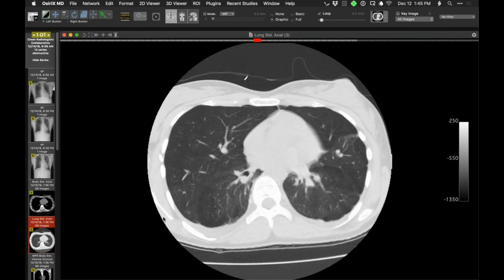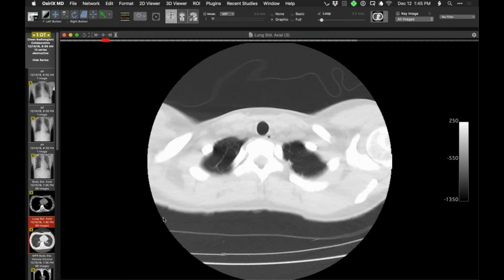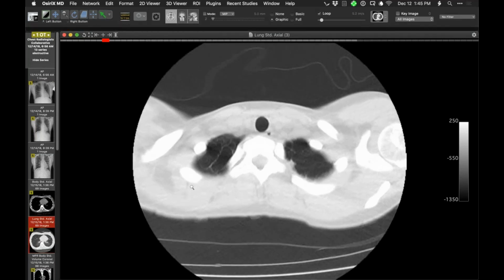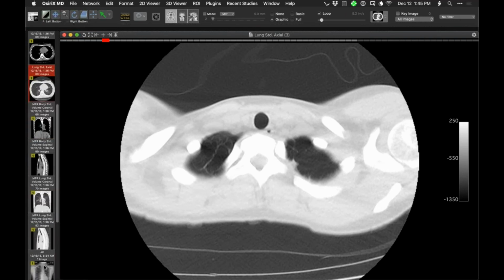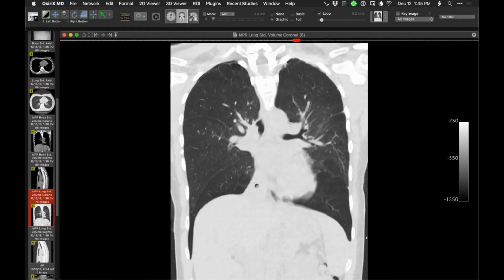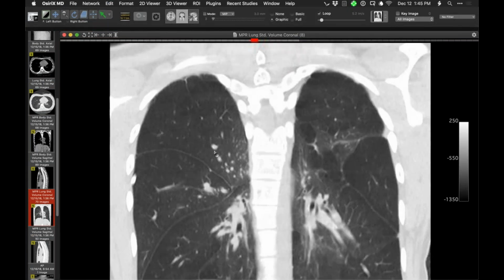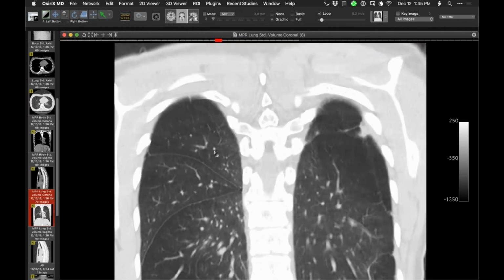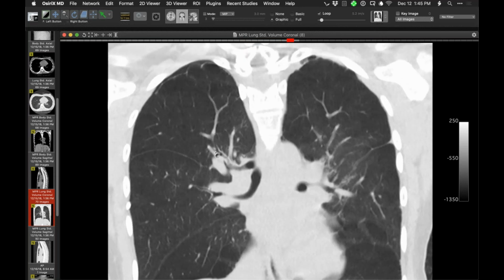Can you go back to the top? Does she have any subpleural bullae? Yeah, this doesn't look like it. No, not really. Oh, she's got apical bullae though. A coronal would be cool. Let's take a look at, I don't think I have from the outside thin cuts. Let me have a look. I don't think I have thins. I think those little bubbles at the apex are all it takes to pop. Maybe in combination with the other findings. Yeah.